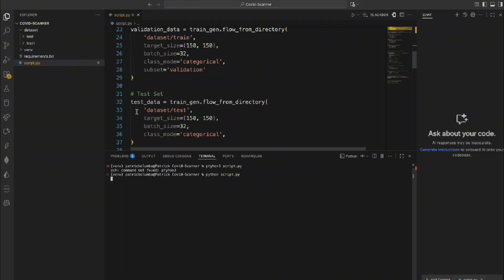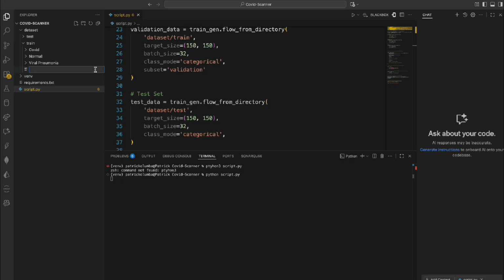Well, while that is going on, we can create a little script to predict a single image. While that is loading up, because it can take some time to run. Of course, when you start building epochs and all that, we'll definitely see it. But let's just create a simple one. I'm sorry, no, I'm not creating that right there. I want to create it in here.